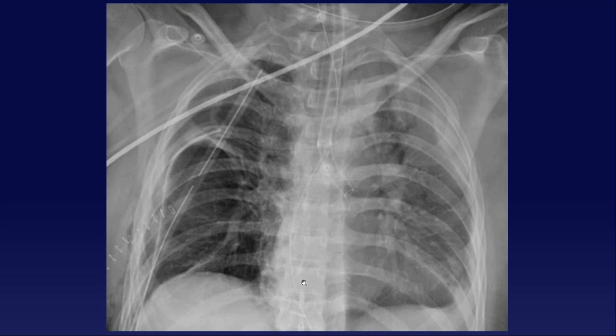Left main stem. Yeah, but isn't this interesting though? Look at that. Doesn't that look a little different than the other ET tubes you've seen? Yeah. So like I said, this isn't entirely fair. You are correct, right? But this is actually okay though. So see this other little border over here? This is actually a dual lumen ET tube so that you can ventilate the lungs separately.